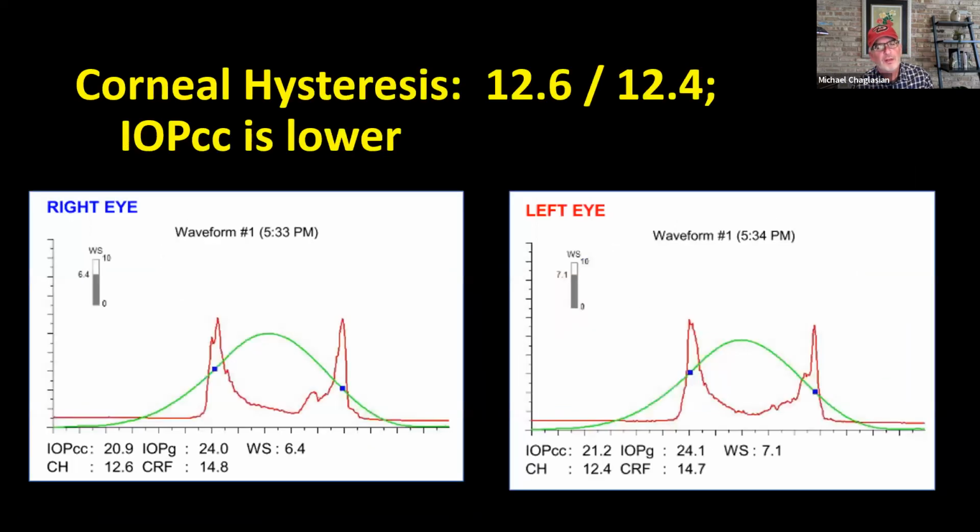For this patient, I did corneal hysteresis. Does not have to be done. It's not a standard of care. This is that device that measures the cornea's ability, which is indirectly a measurement of the optic nerve's ability to resist changes or elevation of intraocular pressure. It's sort of an elasticity measurement. It's really just another risk factor that can be quite helpful, but don't have to have.